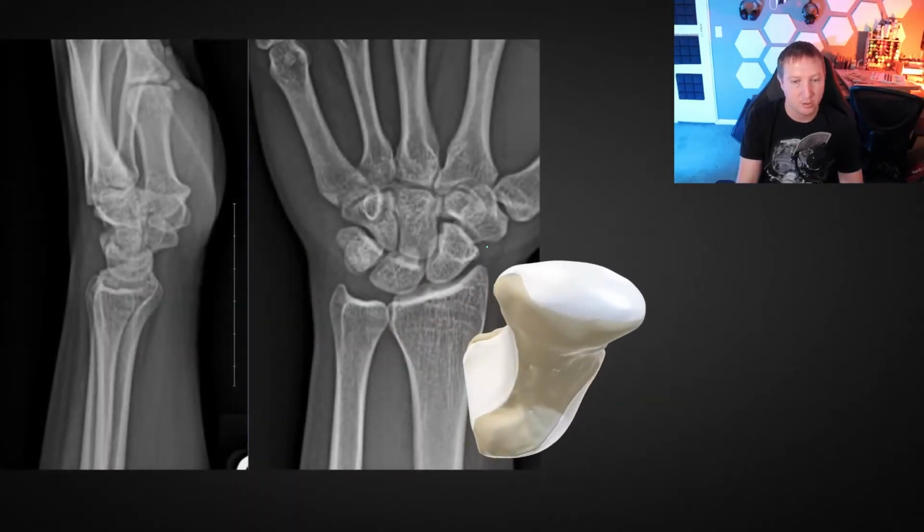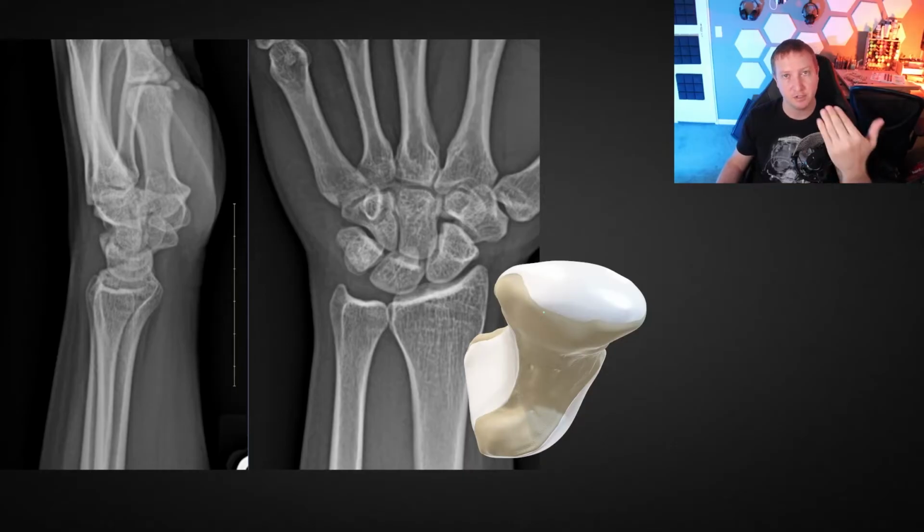All right. So let's talk a bit more about this scaphoid and how foreshortened it is because of that tip. You can see in this case, I've rotated around so it's tipped towards us. And you can see that we can make out the under surface of the distal pole here, and that can project across the waist of the scaphoid. That's just because of the tilt.